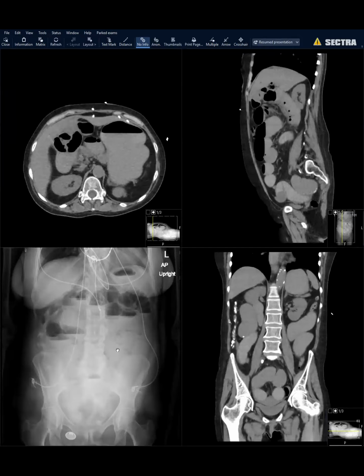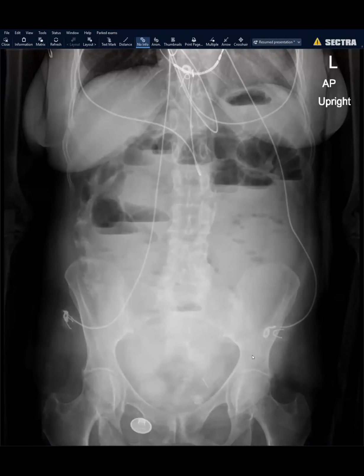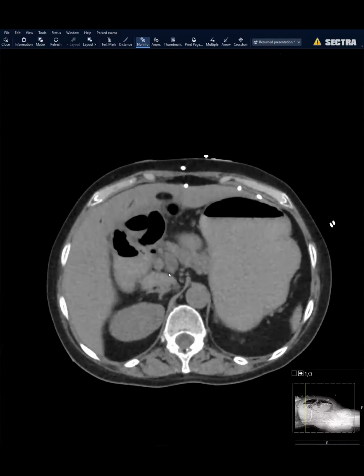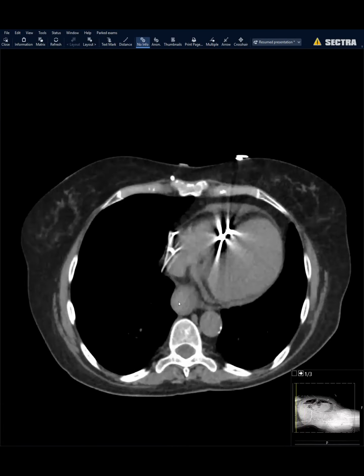This was also a great on-call resident call. So this person came in with nausea, vomiting, abdominal pain. And obviously on the X-ray, we see all features concerning for an SBO. No perforation, no pneumatosis or anything bad. And then once we start scrolling on our CT images, they had GFR issues, so we couldn't give them contrast.